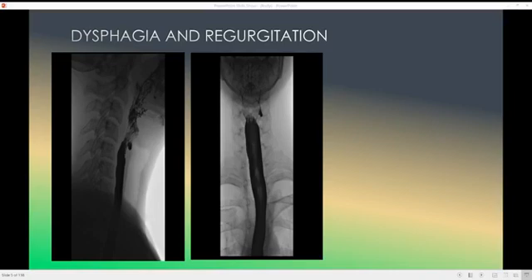Okay, we received some answers. As you see here, this is the diverticulum, but it is anterior, so it is not Zenker diverticulum, and it is lateral. So this is a case of Killian-Jamieson diverticulum. Okay, we move to the next case.